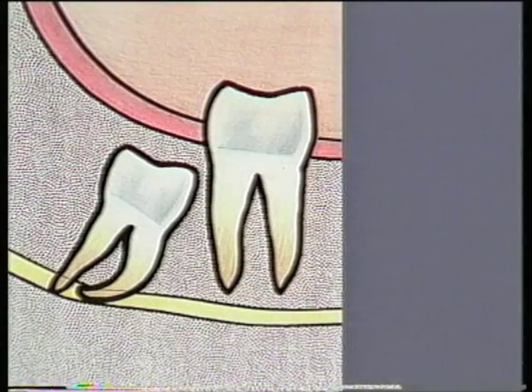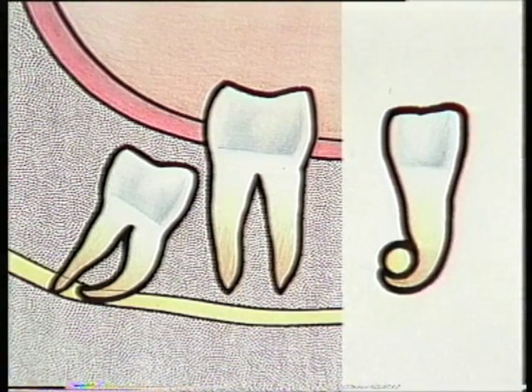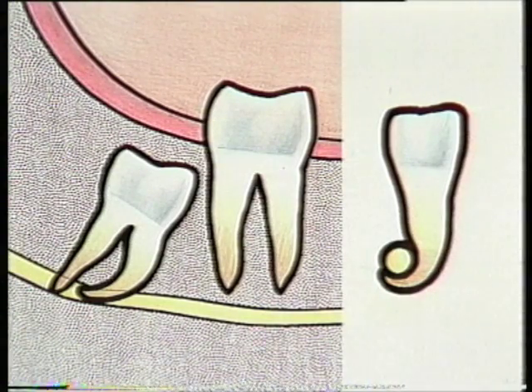What does it look like when there is a more intimate relationship? If we now follow the inferior alveolar nerve in this case, you will see that the upper margin is no longer continuous across the roots, and the lower margin is less well defined. This indicates grooving of the root by the nerve, and in the case of actual loss of canal outline in the upper margin, deep grooving. Damage to the nerve during manipulation of the tooth is therefore possible, and the patient must be warned of this preoperatively.